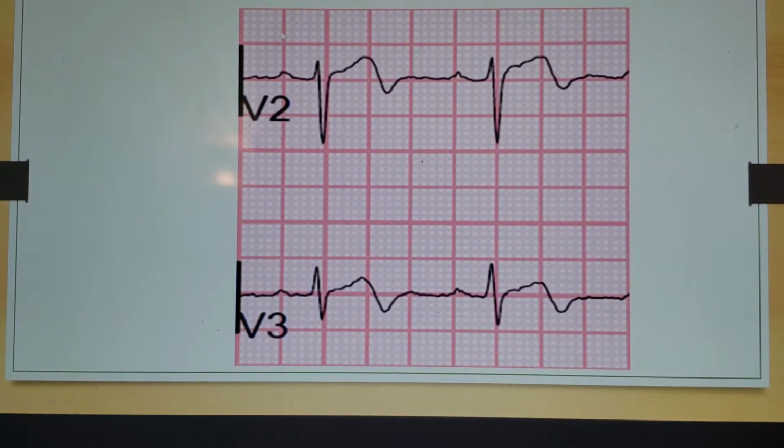So look at that right there, V2. See how that T wave, so this is your P wave. Your QRS looks pretty normal. Then your T wave, up and down. See that? So kind of almost a yin-yang, up and down, V2, V3. So anytime you see that biphasic T wave in V2 or V3, that's Wellens syndrome. And most of these people have very, very severe widowmaker disease and are essentially a ticking time bomb. And a lot of them will be asymptomatic when you get this EKG.